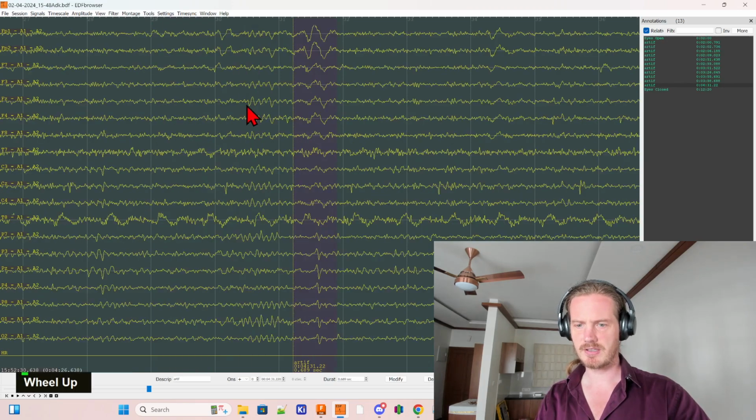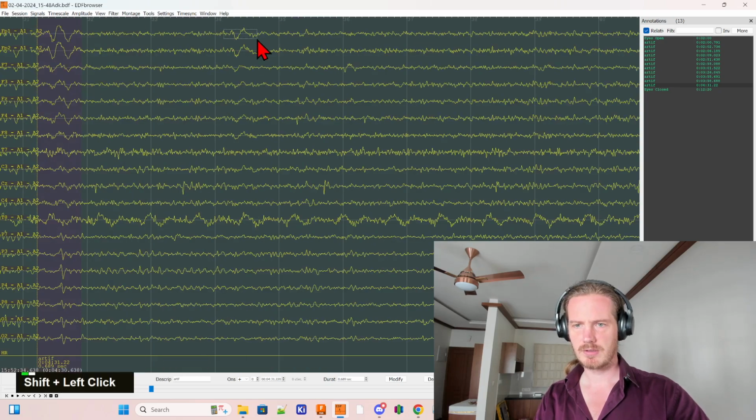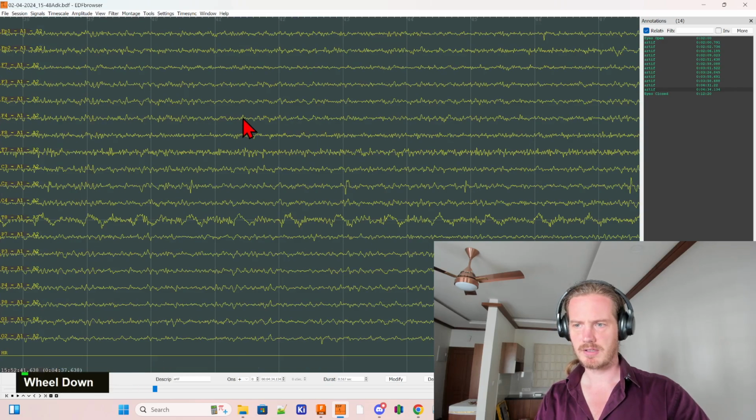This is definitely neural data and you know, a little bit of alpha waves. So we don't do anything with that. We leave it as it is.